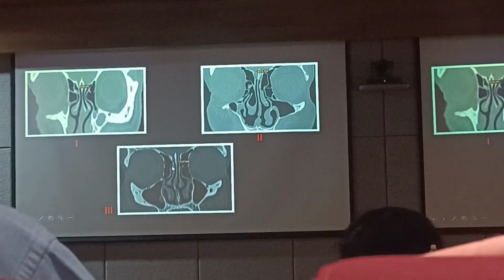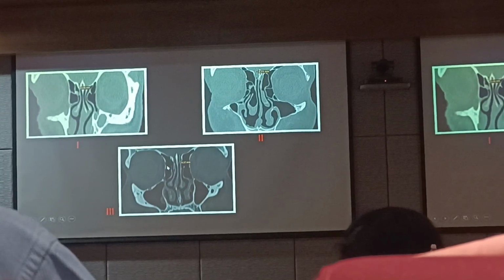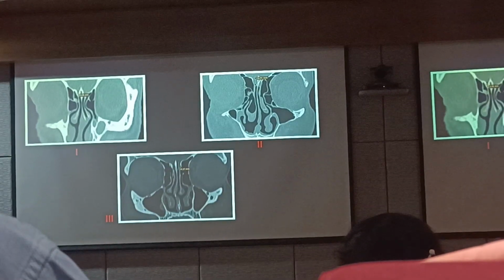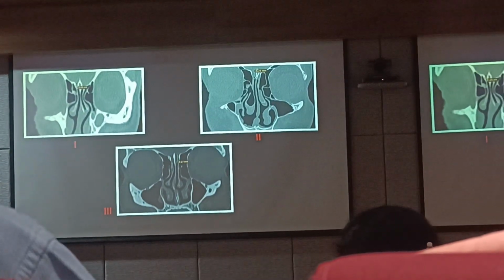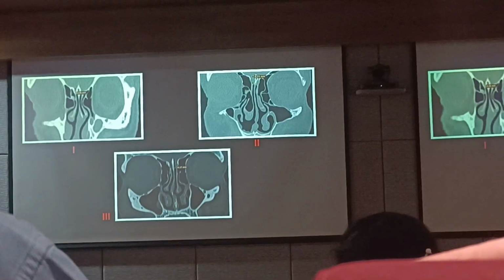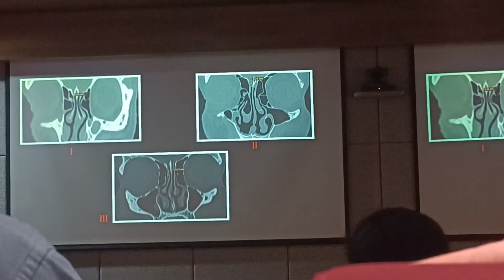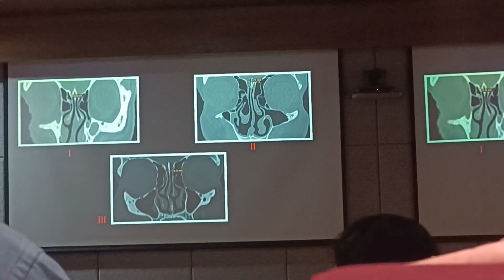And posteriorly, what will you have? A blind cell. So you have 3 or 4. So that's where the intact bulla technique came from. If the intact bulla goes up to the skull base and you keep that intact bulla, that's your posterior boundary. Okay? So once you know the boundaries, you're not worried about what cells these are, right? You just go and clear it.